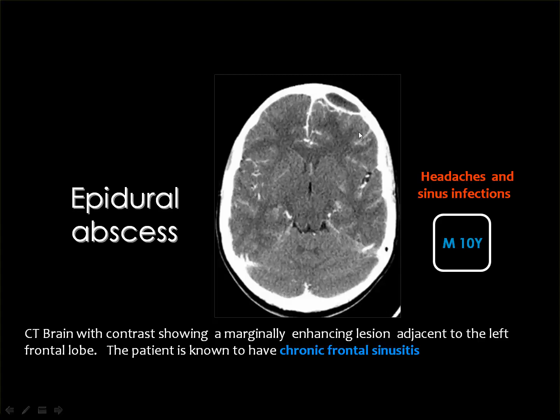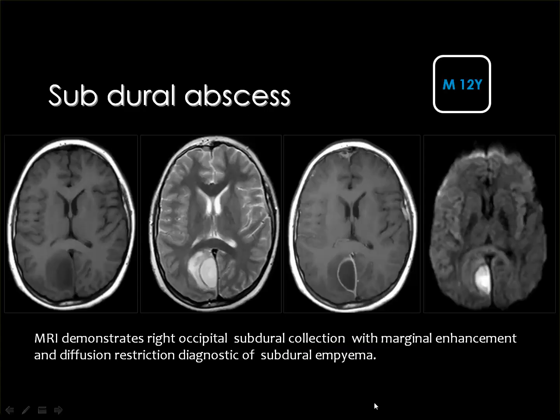This is not the case of epidural hematoma. Epidural hematoma will not enhance with contrast material, even if it is in the chronic phase, if it is black. But the epidural hematoma needs a history of trauma, is usually hyperdense, and sometimes it may be hypodense, but it will not enhance with contrast material.